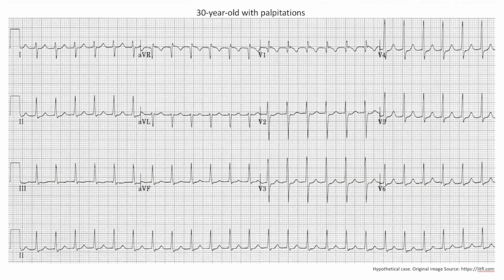The next EKG is again that of a 30-year-old with palpitations. And again, if you look at the heart rate, it's somewhere between 150 and 300. Now, in this case, though, finding P waves is nearly impossible at first glance, but then if you pay close attention, notice how in V1 and V2, there is this small tiny upward blip, almost looking like an R prime.